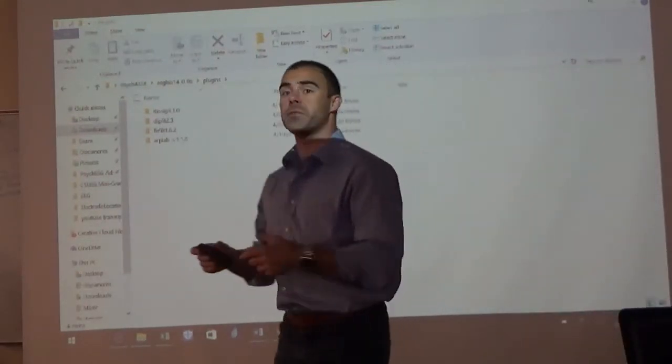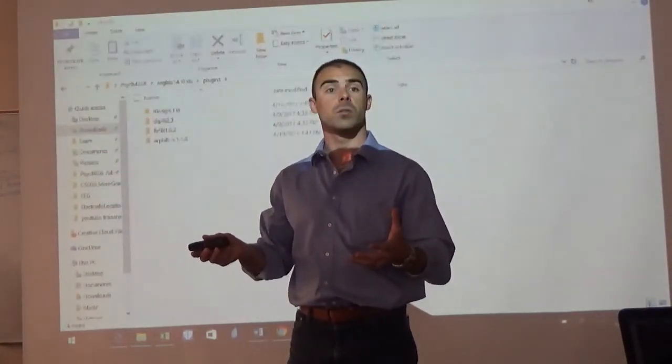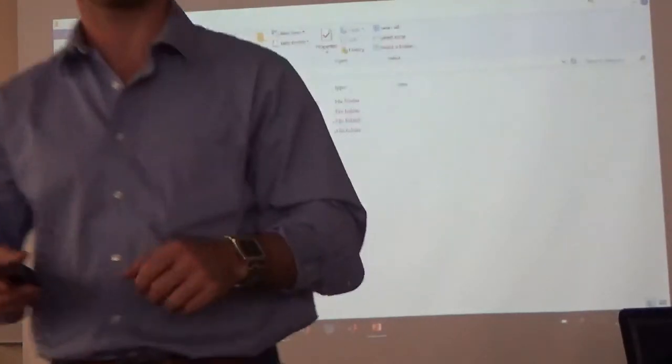Okay, so has everybody finished this? Has anybody not finished? Okay. You guys are good? You caught up? When you're done, you can reopen MATLAB and make sure you have your path set and that it should be good. Are you ready to delete the old version?